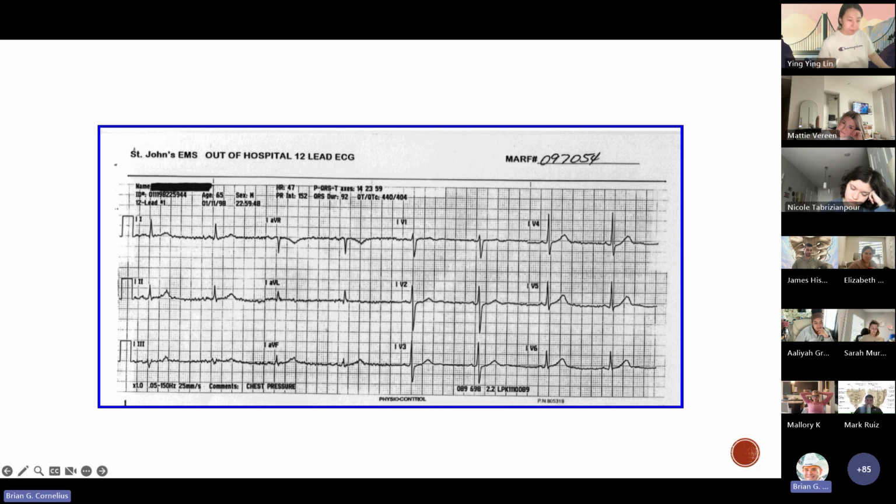So this is not the greatest 12 lead, but we're going to take a look at it and talk about some of the characteristics we see here. So starting off, things you'll commonly see on an EKG. A lot of times there's some patient information there. So age, sex. The computer does a very good job of analyzing what it's given, but sometimes patient factors come into play that can influence things.